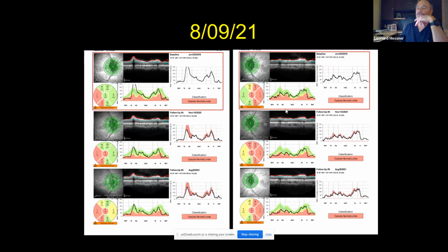Now, if you were to do visual fields, you would see some visual field defect that is going along with this. And the bad news is there's really nothing you can do for it. The good news is that most of these individuals do pretty well. Even though the nerve fiber layer thins itself down over time, most of these individuals function pretty well. So don't get alarmed when the nerve fiber layer is thinning itself down. That's going to happen. It's an expected finding, but understand that this is just something that happens over time among individuals with buried drusen. And you can't put them on eye drops, you can't fenestrate their optic nerves, you really can't do anything to slow this down.